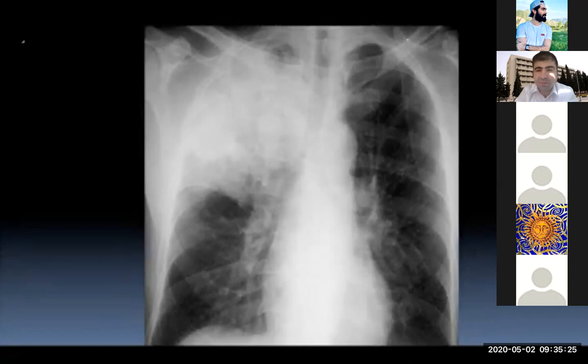Yes, the first one is about the airway. We can see the trachea. I don't know if it's the trachea or the esophagus. And about the bone, there is no bony lesion. Normally you will see the trachea, right? You will not see the esophagus normally. About the bone and soft tissue, there is no bony lesion or fracture. I cannot see it. The cardiac border is clear. There's no abnormal shape in the cardiac border.